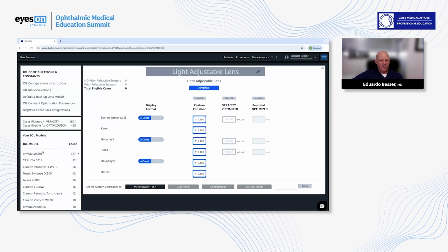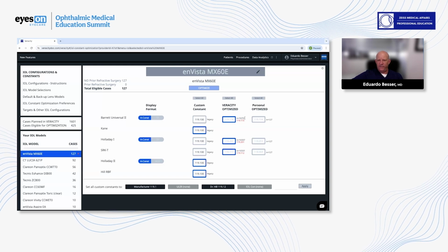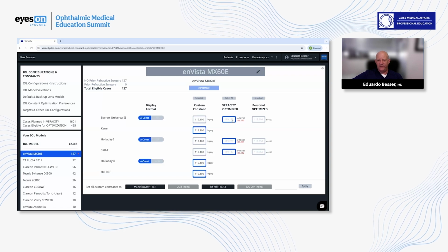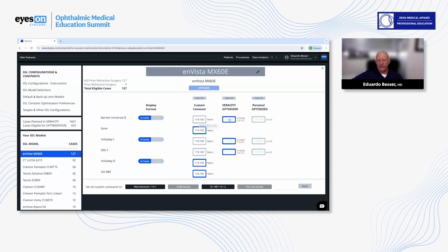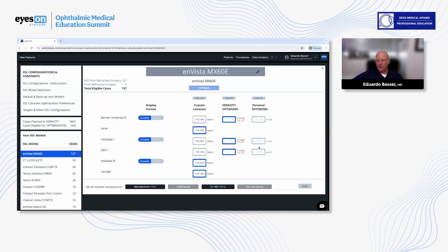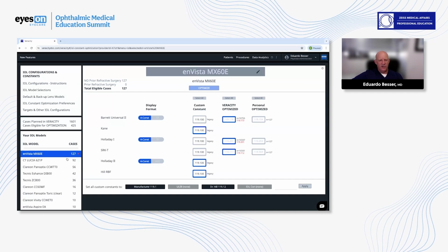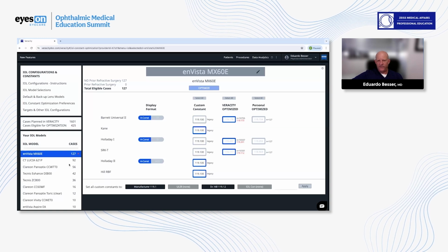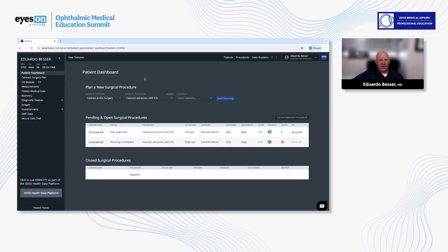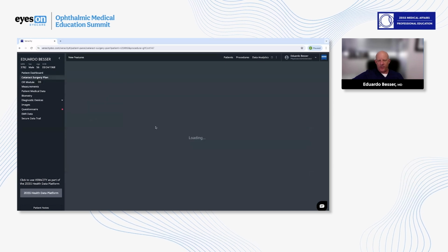And then furthermore, over here, Veracity Optimized means it has 10,755 patients where they recommend an IOL constant of 119.178 as opposed to 119.1. It's not a huge difference, but this is an optimized constant, and then you can do my personalized optimized A constant based on 127 cases. And you can do that once you've got over 50 cases, it automatically optimizes your A constants and you can use them.